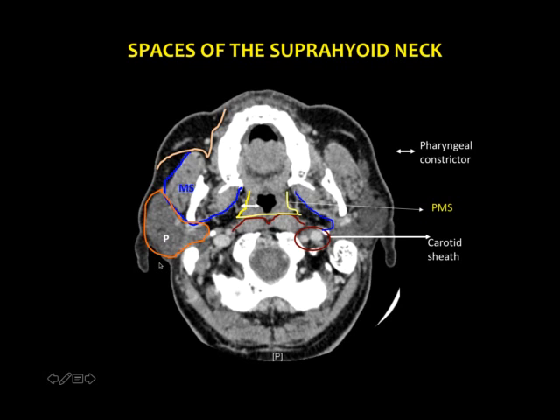Parotid. So the parotid forms the parotid space and it extends into the deep parotid region also. You see that there is a tongue-like structure which is going deeper through the stylomandibular foramen. That is the deep lobe of the parotid and that is also part of the parotid space. Mayur, what is this? This space?